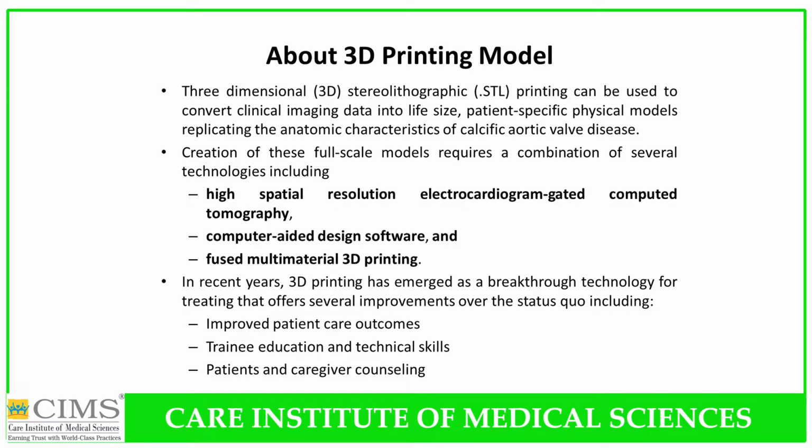So what's a 3D printing model? 3D printing model or three-dimensional stereolithographic, which is .stl printing, can be used to convert clinical imaging data into life-size, patient-specific physical models replicating the anatomic characteristics of calcific aortic valve as well as replicating the anatomy of the aorta.